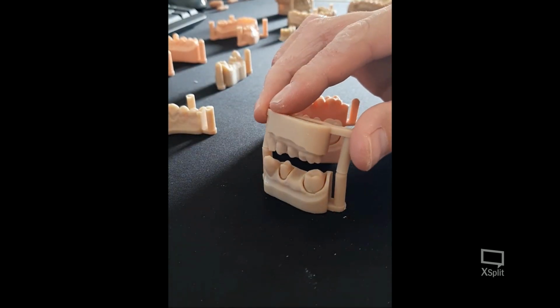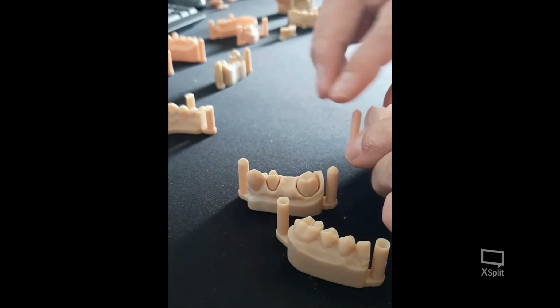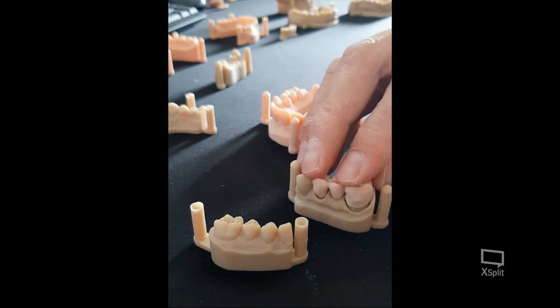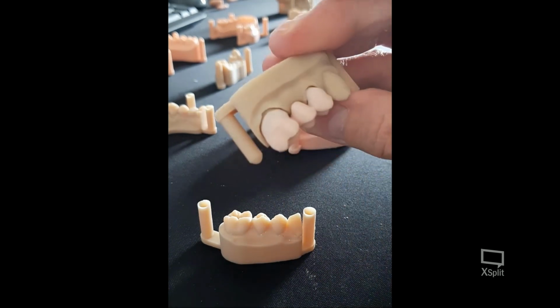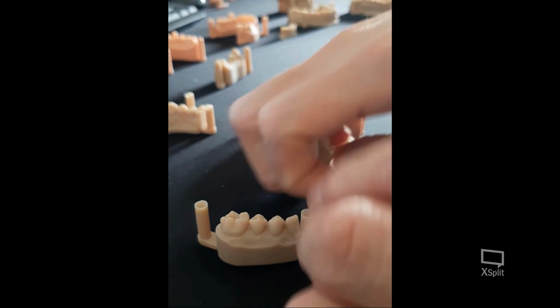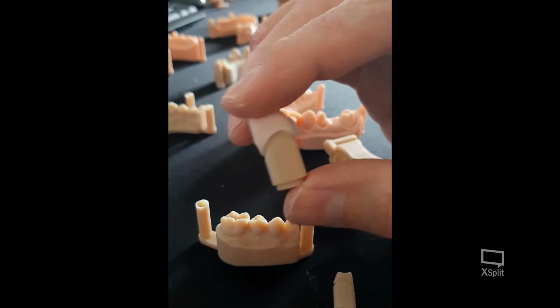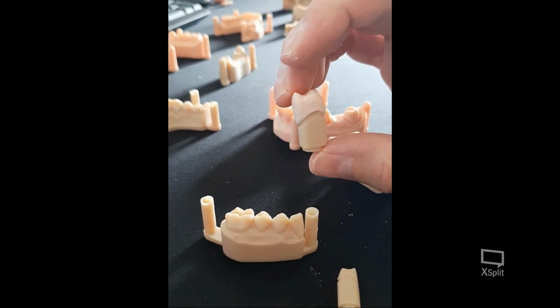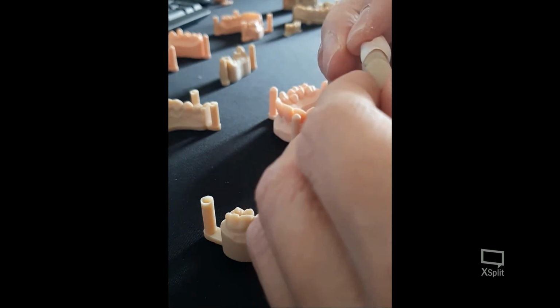I've printed also part of the model with a different material in order to save material and to test the accuracy of the bridge that we designed, and of course also changing the material. The bridge, the frame fit perfectly, and as you can see, close perfectly on the margin ring, also on the part of the model that I've printed with the ortho material. As you can see, the bridge is perfectly closed, also with the ortho material.